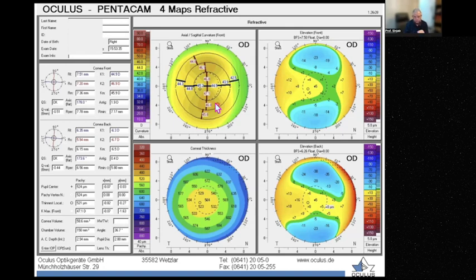And there is evidence for that, evidence-based. While if the superior is larger than the inferior, we can no longer consider it more than 2.5, as in my old YouTube presentations, because I couldn't find evidence for that. So from now on, we will consider only when the inferior one is larger than the superior one, and the value is more than 1.4 as a difference.